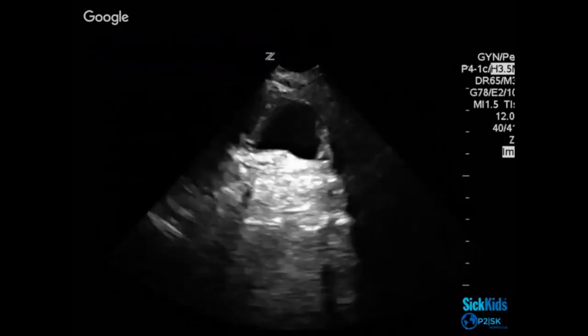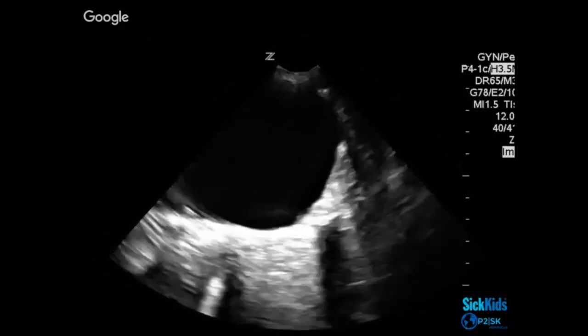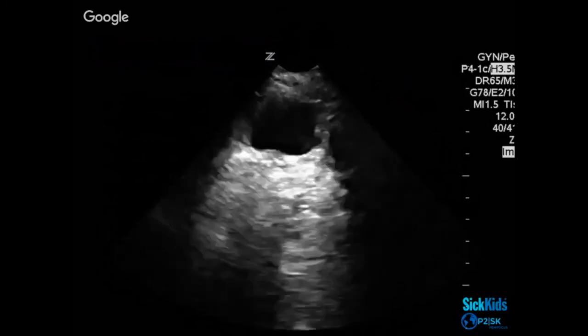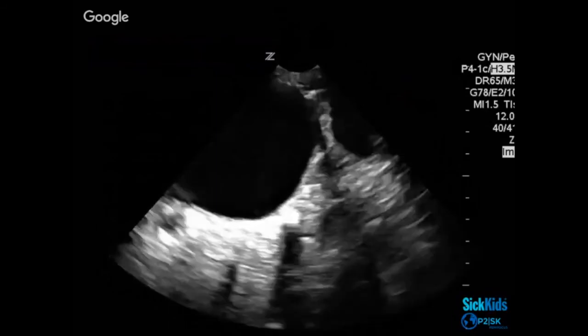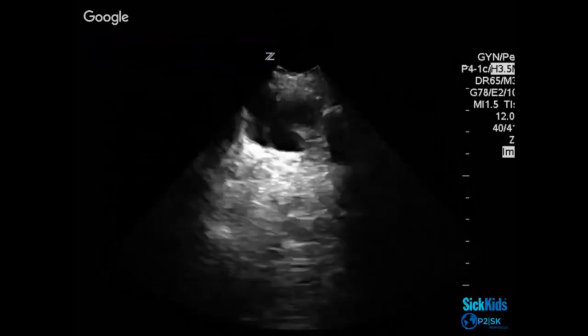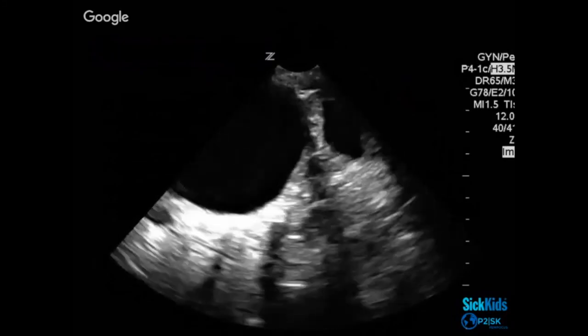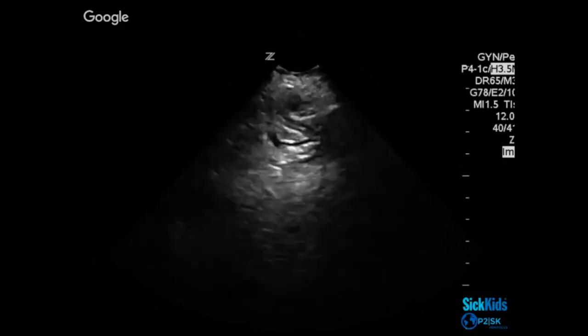That's a tough question. Yeah, it is a tough question. Because of the way you're asking it, I'm assuming the large one is the cyst. Yes. The small triangle one is the bladder. What makes you think the small one is the bladder? The wall is more triangular. It's more trapezoidal, yeah, for sure. And the wall has that classic bladder angle.